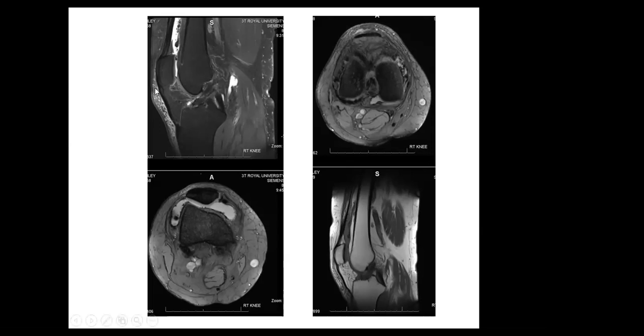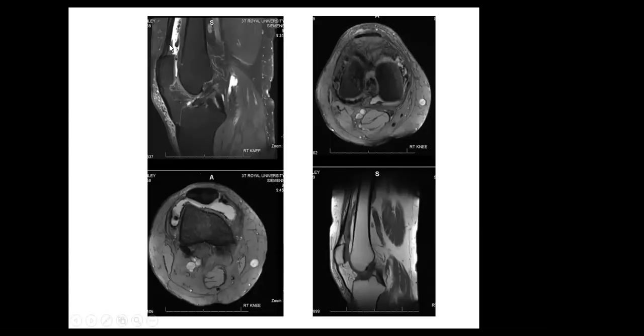So if you had an image, I'm trying to actually move this bar away so we can show you here. Sorry. I think on this image, the synovium was partially imaged, so we had to recall the patient and include the entire synovium, because when they do total synovectomy, they want to see how extensive the disease is. So make sure with PVNS, you have to scan a large field of view in order to see the entire synovium.